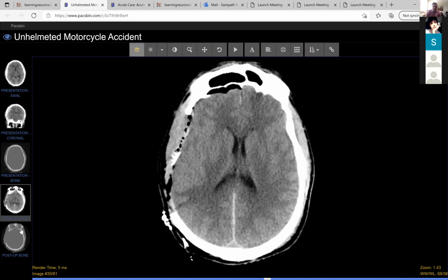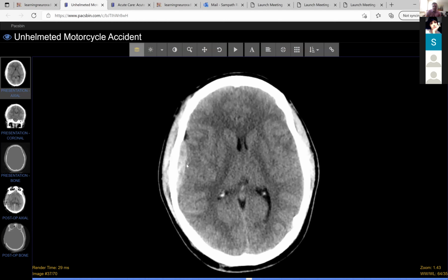So essentially, this is a surgical emergency. That's why this is a very critical diagnosis to make in the ER when the patient comes in, and you have to make it very quickly. The patient has to be in surgery within the hour to save his life, pretty much. So this is actually a pretty good case of that. So let's go through this one.